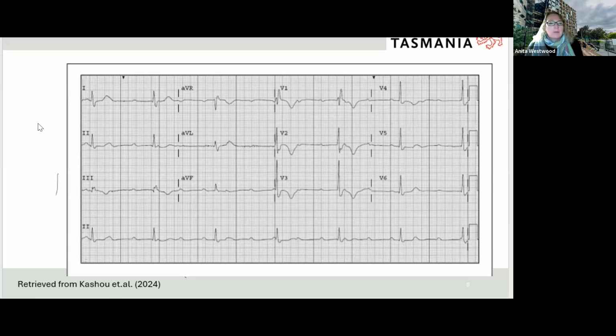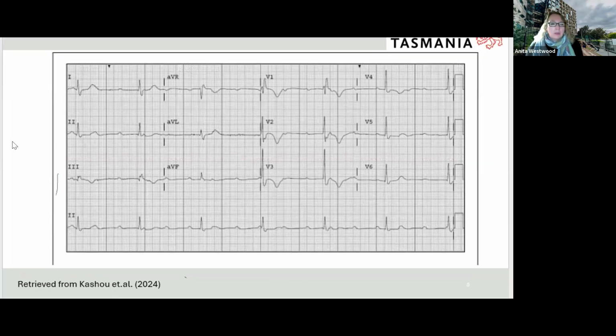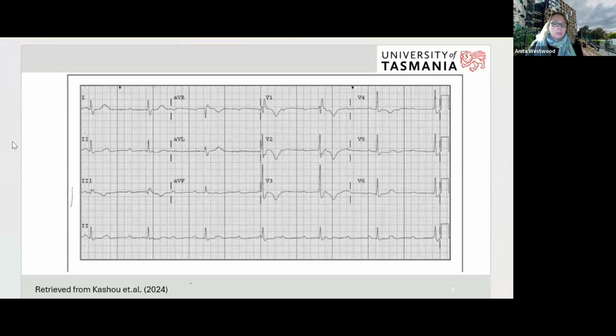Whereas if it's a left bundle branch block, you might bring one of those up later, Georgie, you'll see that V1 will usually be negative, as it is in normal life. So V1's a handy lead to look at. We look at it anyway for the width. And yes, to answer your question before, we need to see changes in both V1 and V6 for a right bundle branch block, with the RSR complex and the width as well. Because remember, you're looking at both aspects to be able to diagnose it.